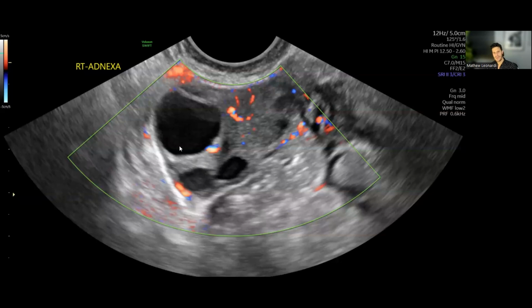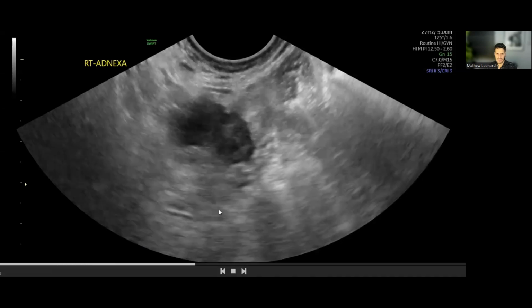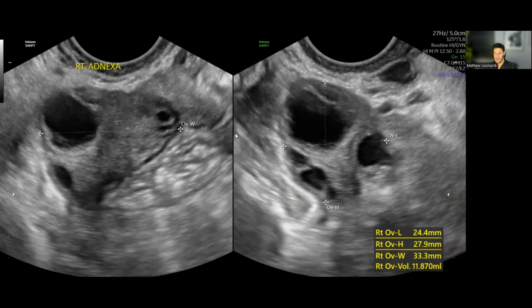Does it have a peripheral ring of vascularity? I knew that was the next picture coming because that's the sequence of events in my brain. Nah, a little bit. So has it just ovulated? Quite possibly. A little bit hard to tell. Day 13 is maybe a little bit early. Day 14 is more typical, but if this patient has slightly shorter cycles, that might make sense.